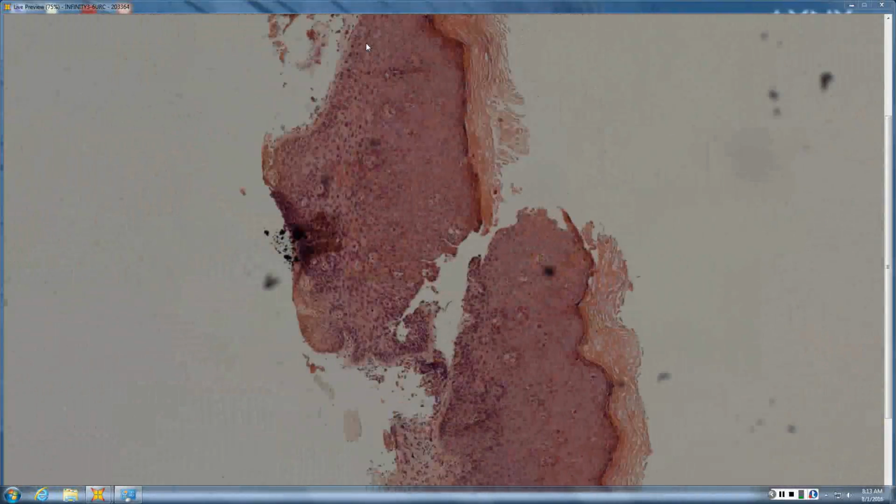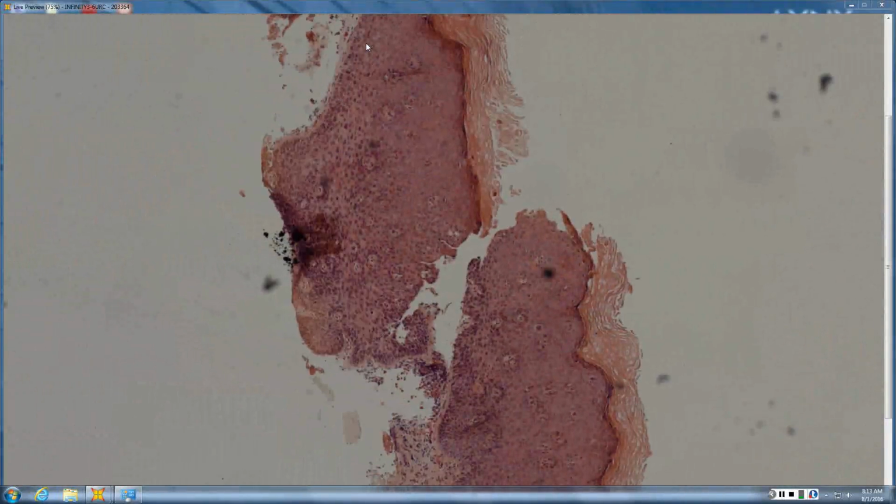And HPV-induced Bowen's, genital Bowen's, tends to look different. The cells are smaller. They're less atypical. These are commonly missed and not called malignant at all because they tend to be small cell Bowen's. So unique look in the stratum corneum is one of the hints. The cells tend to be small but hyperchromatic, and that's another one of the hints.